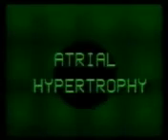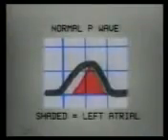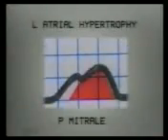Atrial hypertrophy. The atrial hypertrophy can be diagnosed from the contour of the P waves seen best in lead 2. The P wave represents depolarization of both right and left atria. The SA node starts the depolarization in right atrium. So the initial part is contributed by the right atrium and the later part of the P wave shaded in the diagram is contributed by the left atrium.